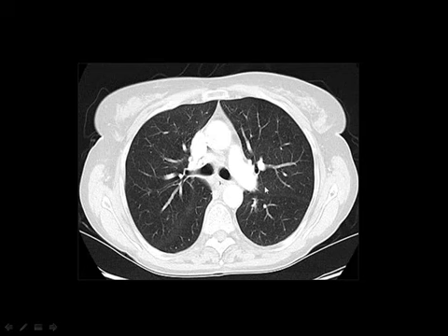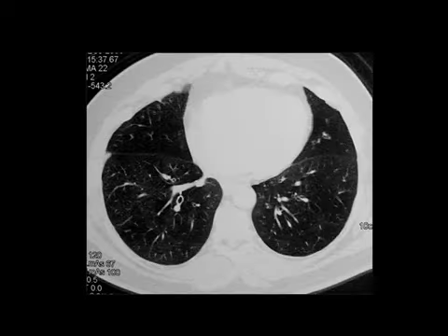We have three levels: the level of the trachea, the level of the main bronchi and the level of the heart. At what level are you now? The second level, the main bronchi. Then, whenever the trachea divides, the section is divided. Then, what do you think of this area? Left upper lobe. And what do you think of this area? Right lower lobe. Then we came to the cardiac shadow.